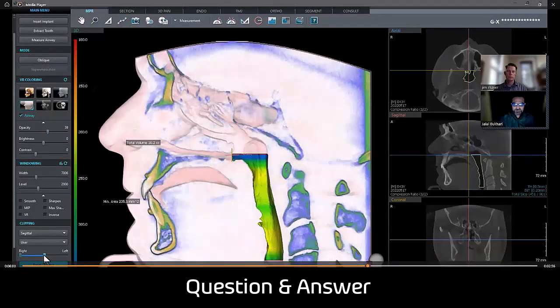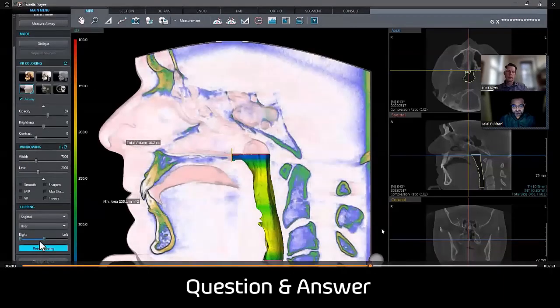And again, it's important to note that if it falls within a range which is low or below average, it doesn't necessarily mean that the patient will be subject to OSA, but it can help us tell the patient or the provider, specifically a sleep apnea specialist, that hey, we saw on CBCT imaging that the cross-sectional dimensions of the airway, or even the anteroposterior dimensions of the airway, are narrow, and you might want to follow up accordingly. And it's a great tool to use.